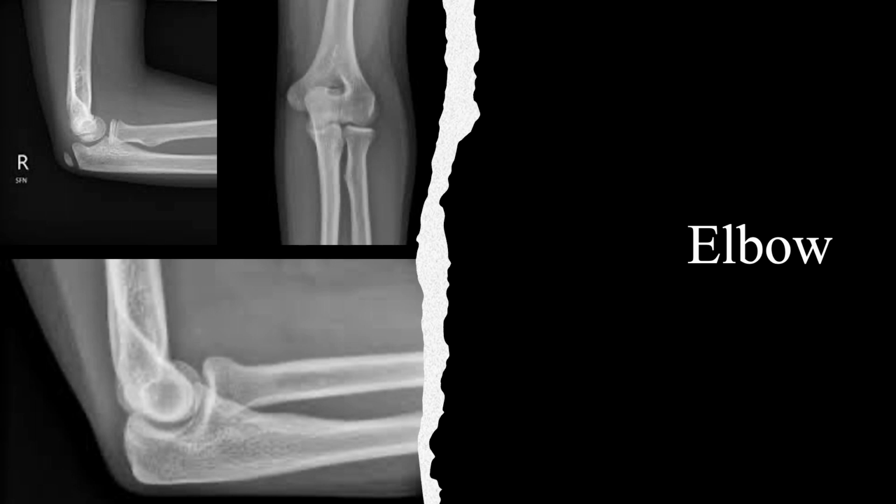And then again, examine all the other bones and other structures for any fractures. You just want to be very careful looking at that. Make sure that those cortical disruptions in the radial head, you look very closely for. Look for any displacement. Look at the gap between, it should be nice and symmetrical as you go across.